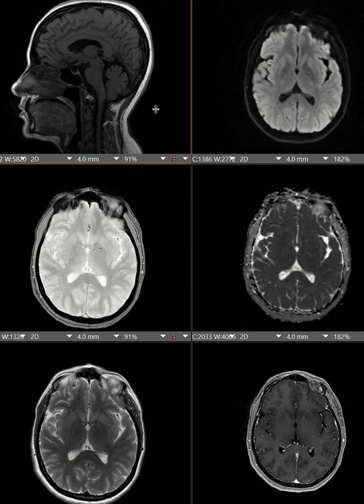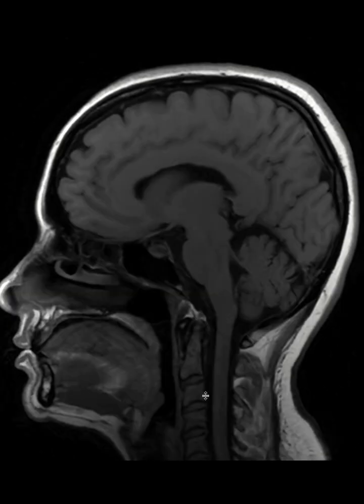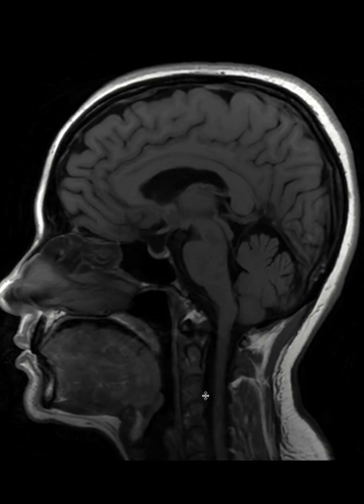Basically, this entity, the demyelinating process, the hallmark is multiple sclerosis in adults. It usually happens in women in their 30s or 40s, and they come with weakness, numbness, some sort of visual disturbance or visual problems. And this patient specifically presented with headache, very non-specific. Sometimes the radiologist is the first person to make or suggest the diagnosis, because this is not an imaging diagnosis, it's usually clinical, but we have some imaging features that are highly suspicious or concerning for the demyelinating process. Okay, let's dive in.